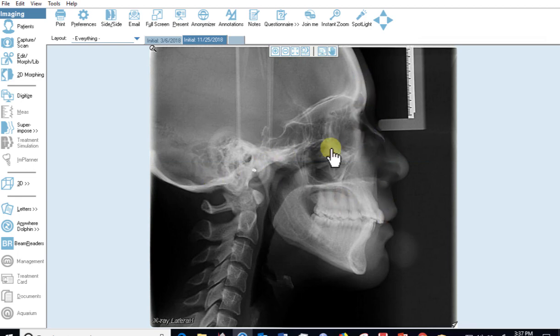Their face just looks like it's tipping up. If the patient were looking directly into a mirror, that mirror doesn't seem to be straight vertical. This nose rest should be at nasion, and it's a little too far down because the patient is looking up.